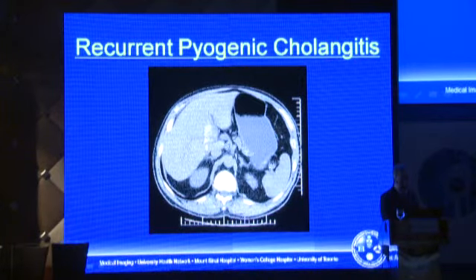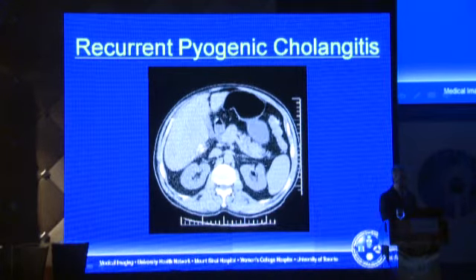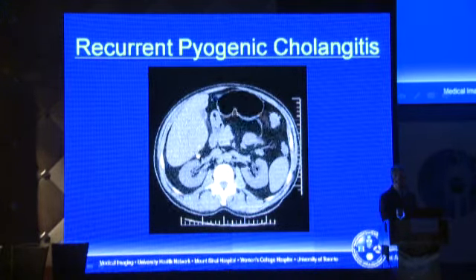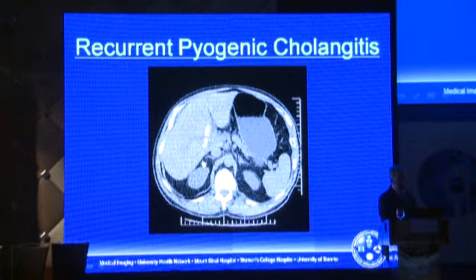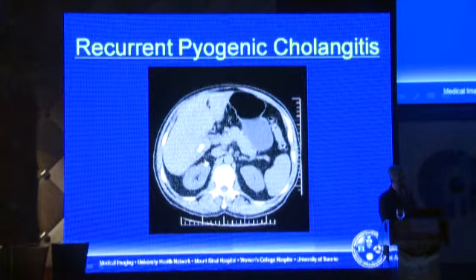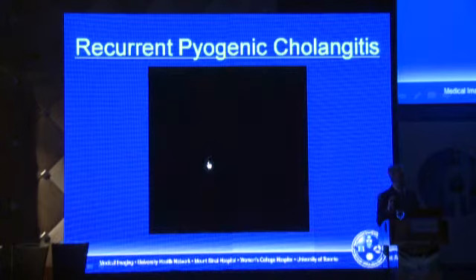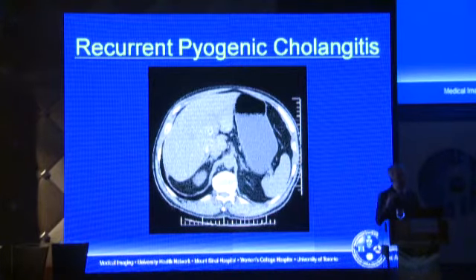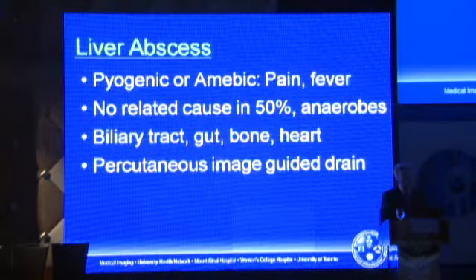And as we interpret this, we see these intrahepatic biliary stones, but note the marked atrophy here of segments 6 and 7. So these bile ducts have migrated all the way to the liver capsule, yet the overall morphology of the liver otherwise looks normal, and that's because the healthy segments 5 and 8 have hypertrophied to compensate.